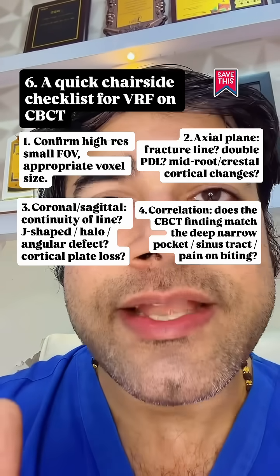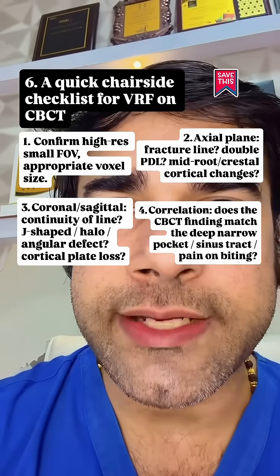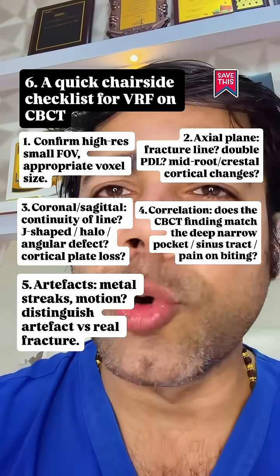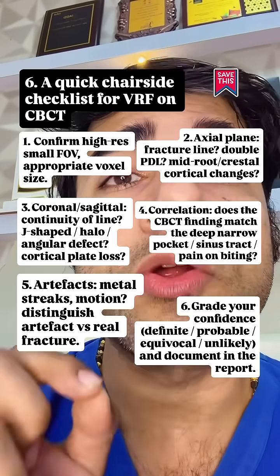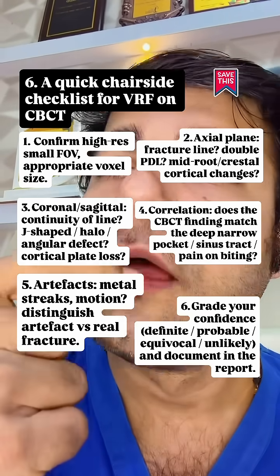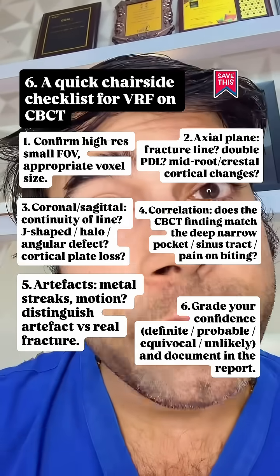Correlation: does the CBCT finding match the deep narrow pocket, sinus tract or pain on biting? Artifacts, metal streaks, motion: distinguish artifact versus the real fracture. Grade your confidence: definite, most probable, equivocal, unlikely, and document that in the report.